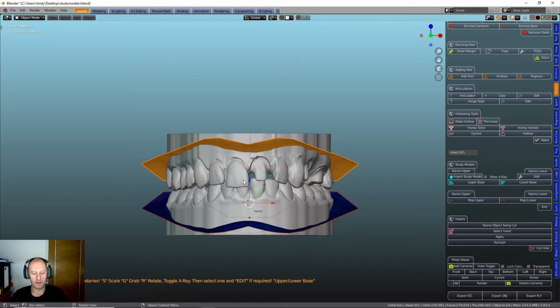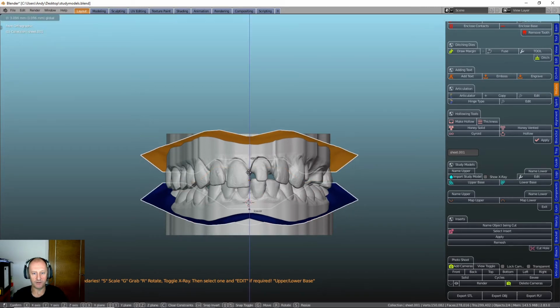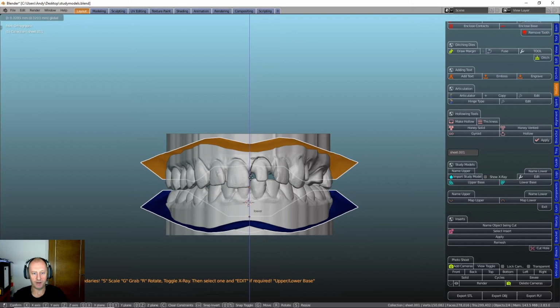This arrow, as you can see here, now this is where I'm going to use the tilde key. So I'm going to press that. I'm going to line it up from the front. So we've got a front view. Now, obviously both these bases are highlighted. We've got the move arrows here, so we can obviously move the bases up and down.